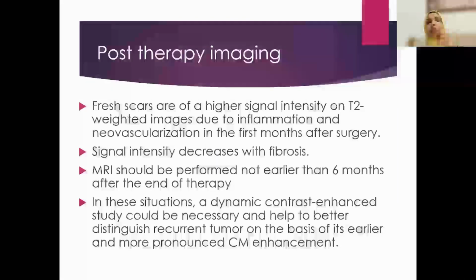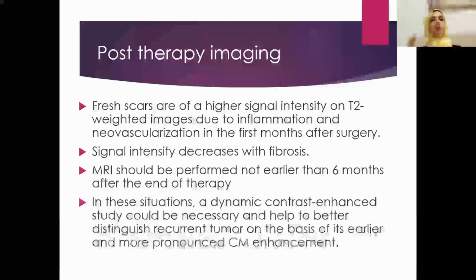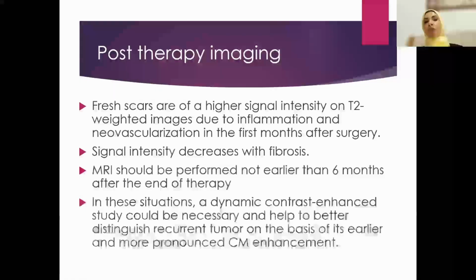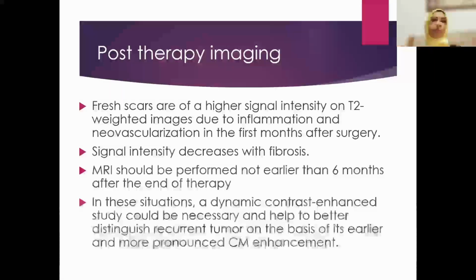Patients with cervical cancer subjected to therapy like radio, chemotherapy, and coming for follow-up, we have a problem here because radiation-induced scar in the beginning, they are having inflammation, edema, neovascularization, and all that will induce T2 hyperintense signal, same like recurrent or residual tumor. So differentiating post-therapy changes from real tumor is difficult in the first 6 months.